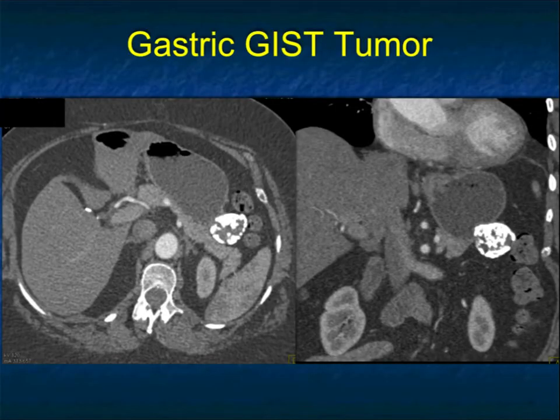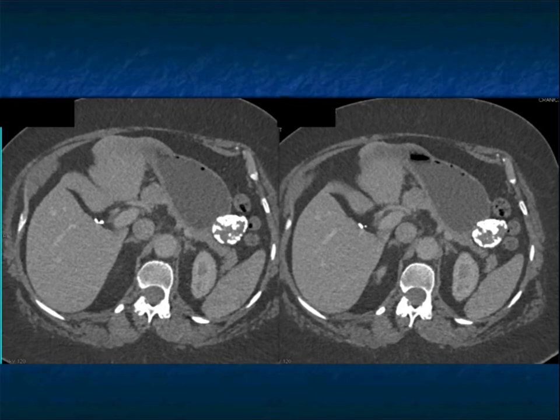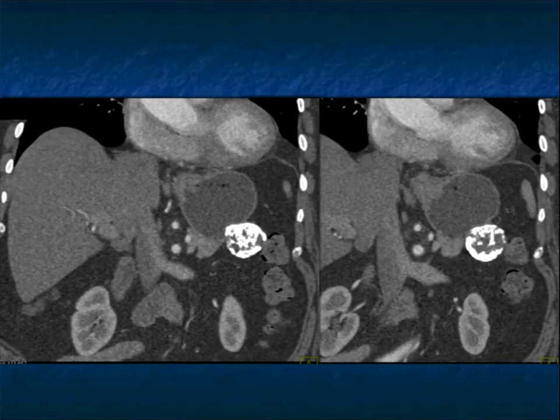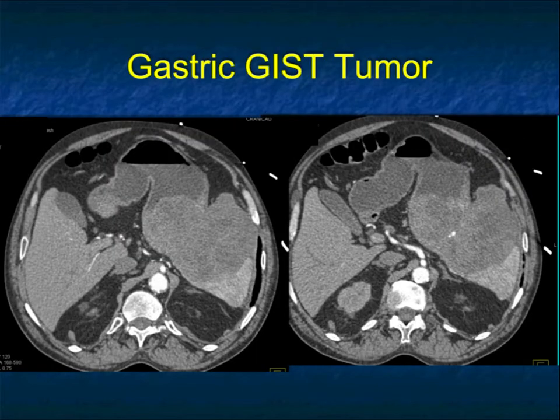And here's another GIST tumor, exophytic. This one is nearly entirely calcified. I will admit when I see lesions that are almost all calcified, I think of leiomyomas, but you can see the same thing with GIST tumors, and this was eventually resected. Again, it was benign. The dense calcifications really are in the patient's favor. So this is a very nice example of a benign GIST tumor, but again, exophytic in nature, also showing you to remind you that GIST tumors can calcify.